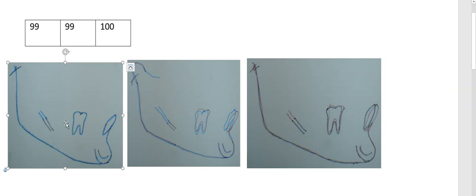If the third molar is present in all the lateral cephs which are used for superimposition in a case, and their roots are not developed, or they develop less than one third, you can use the crypt of the lower third molar. I haven't used it here because it's an adult patient. Any stable cortical contour in the mandible, there was none in this case.